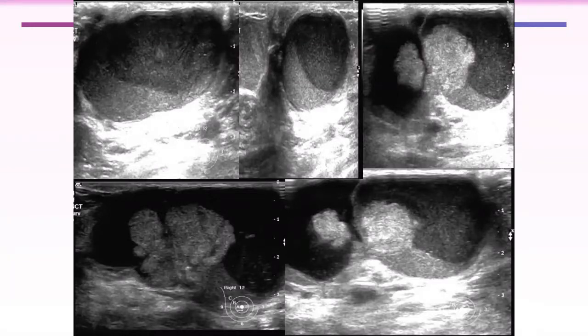You cannot see it all to tell if it is circumscribed or not, but at least there is a complex cystic mass with a solid component. It looks like a projecting solid component, even containing the microcalcification you have seen in the spot magnifications. It looks malignant. Flower-like appearance. This we call a papillary projection. Yes, this is a papillary projection, and it is heterogeneous.